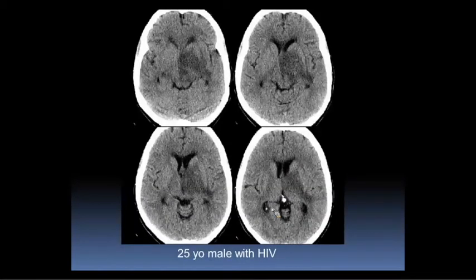It's another case, a patient with HIV. You can see that there is parenchymal hypodensity here. It looks like there is some mass effect associated with it. There looks like there's narrowing of the third ventricle here. So you'd be worried about this person developing hydrocephalus. And so in an HIV patient, we're concerned for opportunistic infections. What else, possibly? You certainly get lymphoma as well.